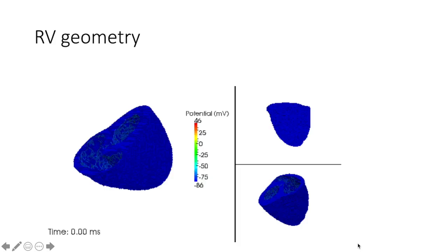Now, the difficulty with the right ventricle is its shape, and it's very odd. It's this odd triangular crescent shape that's very, very difficult to depict well with any 2D imaging technique, such as echocardiography, for instance. You can underrepresent its size and misjudge its shape depending on how you slice it. So actually, it's very important that you collect all the views before you make your judgment on its size and its function, more so perhaps than any other structure in the heart.